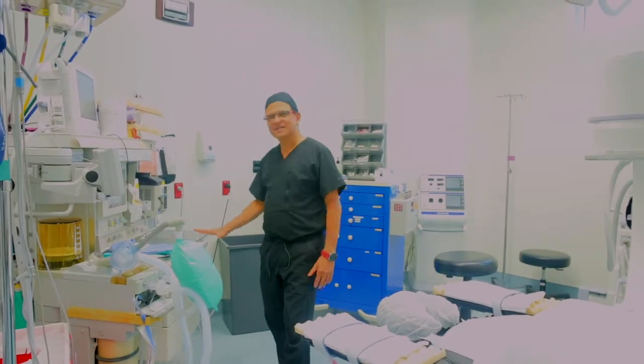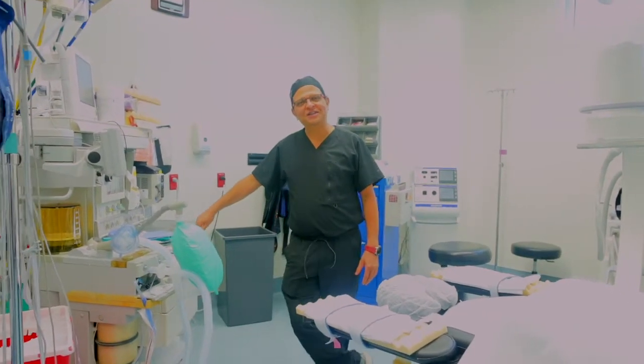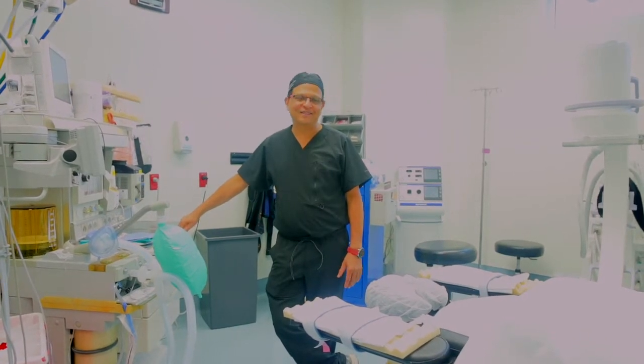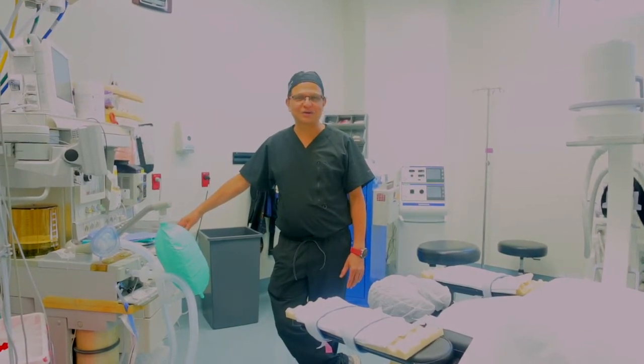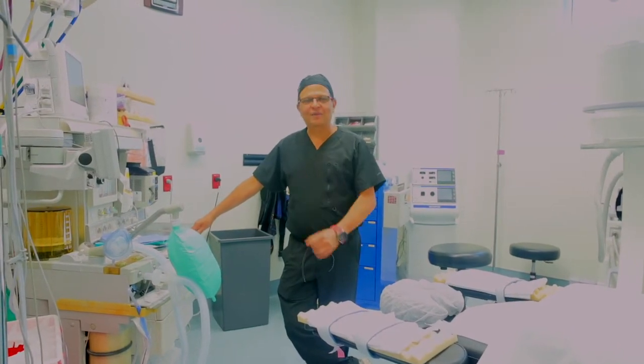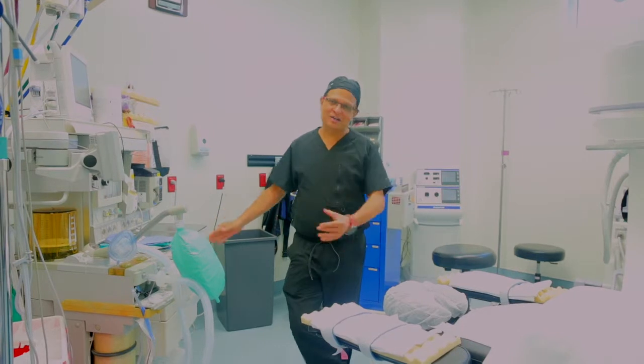So this is the anesthesia machine and anesthesia setup in a nutshell. There are a lot more details that go into it, but this is just an introductory video to tell you what an anesthesia machine looks like.